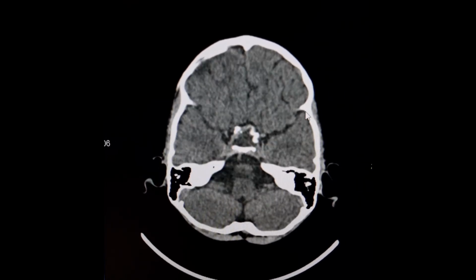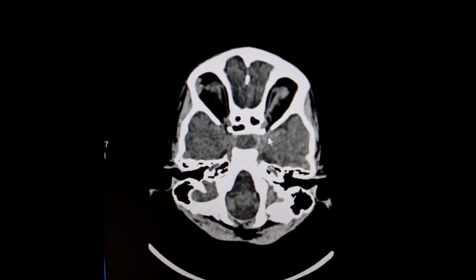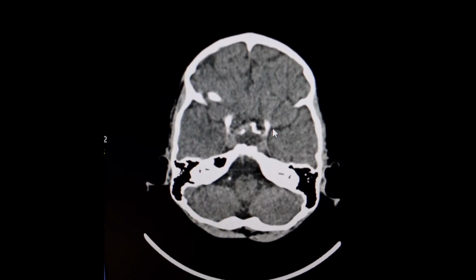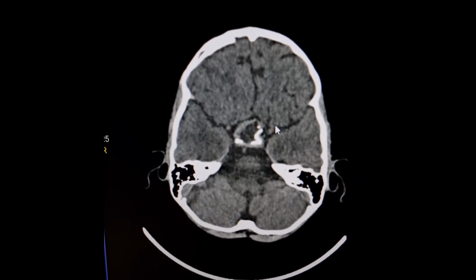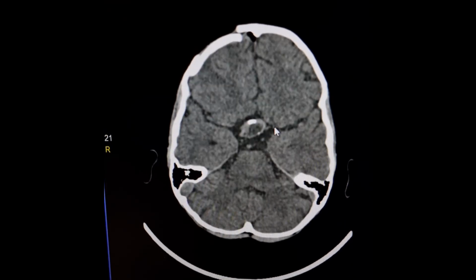Now first let me explain to you the craniopharyngioma. It is intrasellar as well as in suprasellar location. It is hypodense and is predominantly cystic. Curvilinear irregular calcifications are seen along its walls. Please see that it is extending into the suprasellar region.